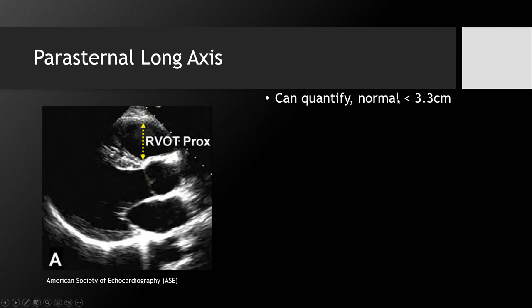And if you're not taking your advanced critical care echo boards, this is probably not the most important thing to know. What's probably more practical is that eyeballing the RV is, in my view, much more straightforward than eyeballing the LV. And in this case, you can eyeball using the rule of thirds. The rule of thirds is that in the parasternal long axis view, your left atrium, your LVOT, and your RVOT should ballpark all be the same size. So if one of them is much larger than all the others, that's probably enlarged. That's an easy way to help eyeball.